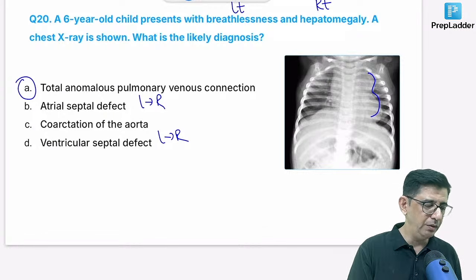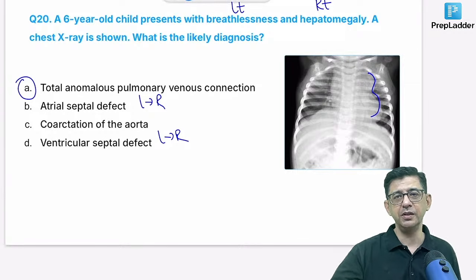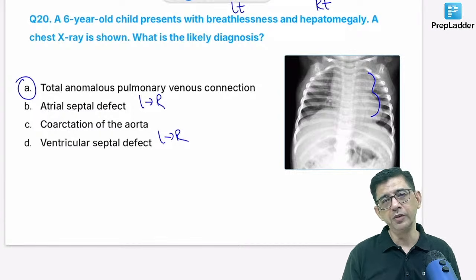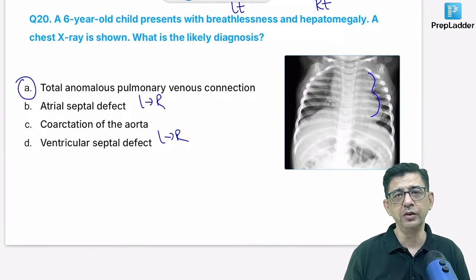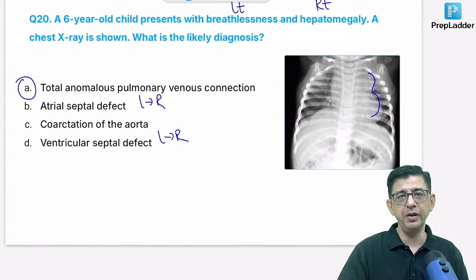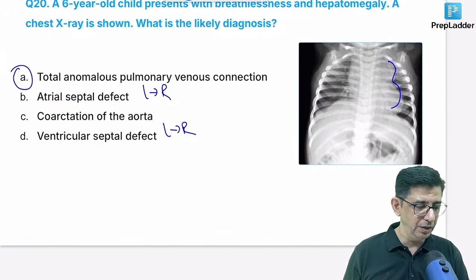So this would be the last X-ray for today, guys. This was a quick short discussion where we just tried to fine tune your reflexes for today. So yes, the figure of 3 sign would be present for coarctation, but at the moment what I try to draw is more that snowman or the figure of 8 appearance here, considering the age group of the patient as well.